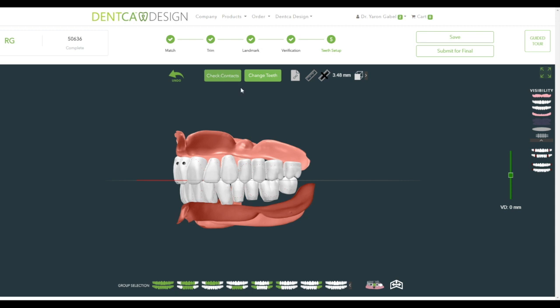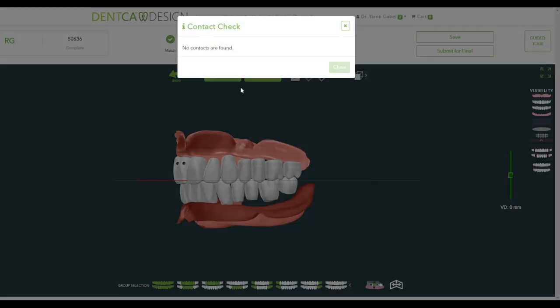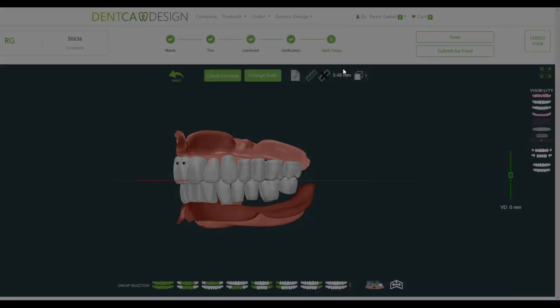Please note that overlapping is not a big deal when it comes to printed dentures. Since the teeth are printed in blocks, the software will automatically relieve the interproximal excess and merge the teeth for you. For single arches, please note that the software will automatically relieve any occlusal areas that are making active contact with the opposing dentition. It is recommended to intentionally slightly overlap the denture teeth cusps against the opposing dentition in order to obtain an ideal occlusal adjustment.